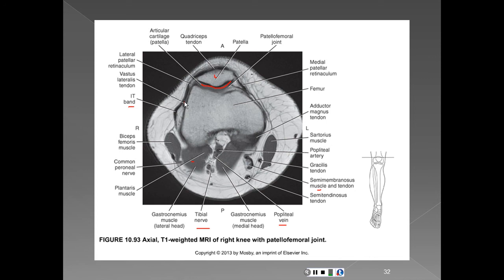So if you're doing a person and their chief complaint is rupture of the quadriceps tendon, then you understand where to look. Rupture of the tendons of the posterior thigh compartment, or the hamstrings, then you want to know what to look at. Here's a good picture of the sartorius muscle. Remember, this muscle begins all the way up at the top of the ilium of the pelvis, and here we are down into the tibia.